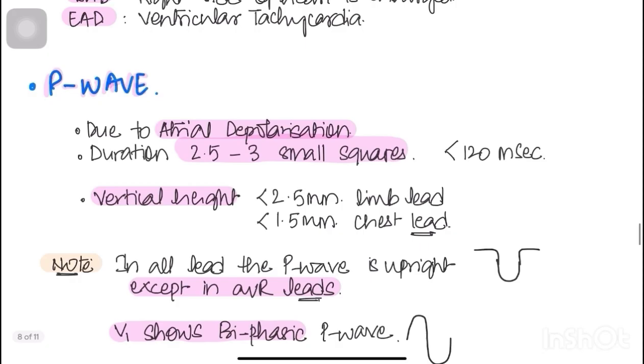So now let's see each wave. Although I should have discussed it before, that would have made the topic a little bit boring. So let's start with each wave and what it indicates.